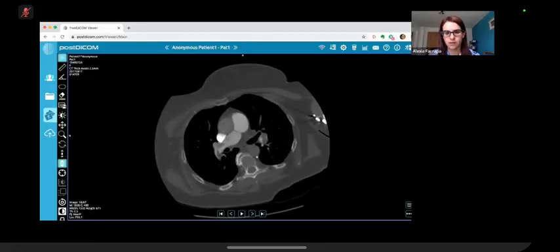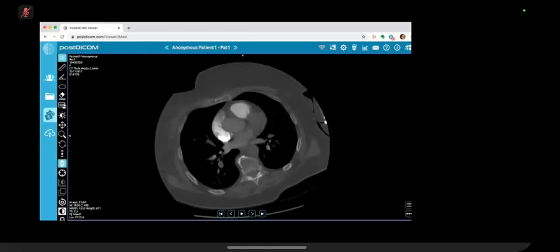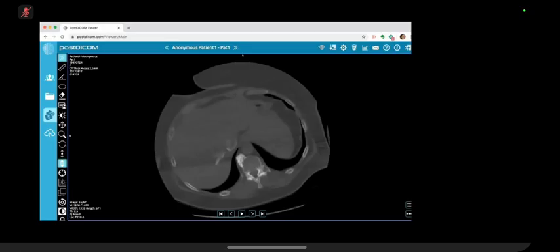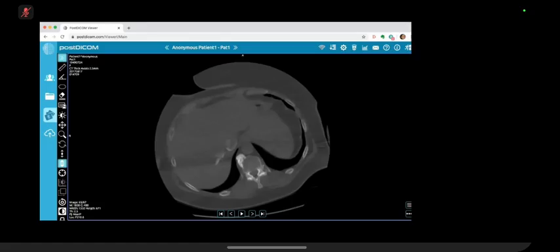And whenever you're ready. So these are axial CT slices of this patient's chest. This is a CTPA. It's windowed adequately to show that there are bilateral pulmonary emboli. I don't think I saw any saddle embolus in the MPA. I think that's the main diagnosis. I'll look through this on lung windows as well to look for any abnormalities. Those are filling defects, and the most likely thing will be pulmonary emboli.